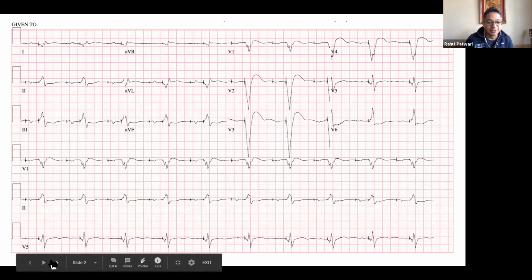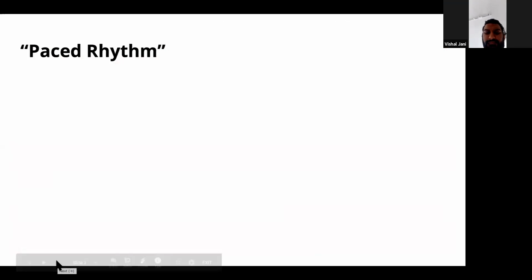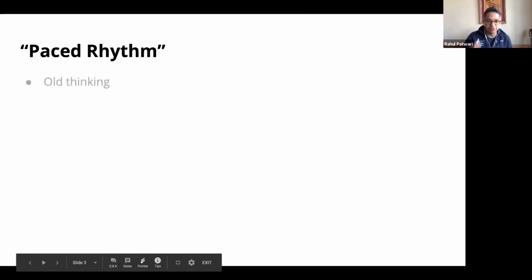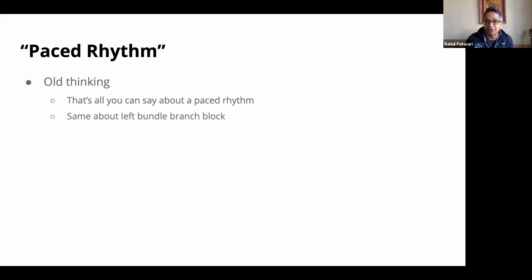All right, let's go forward then. So paced rhythm, that's what we figured this would be, right? And it used to be, in our old thinking, that if someone said they had to do an EKG with a paced rhythm, that's all you could say. It's paced. That's all I can tell you about it. And the same thing about left bundle branch block, which paced rhythm is really a subset of, because the pacer is usually somewhere causing that kind of morphology, that it obscures everything else.